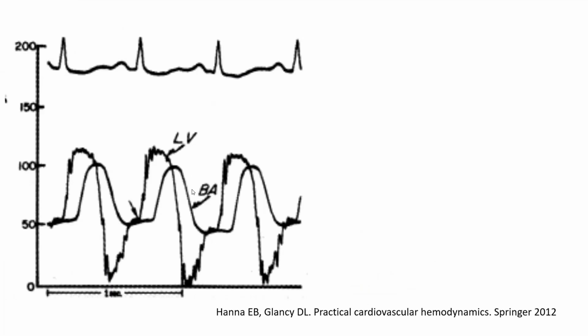The brachial arterial waveform, as in any systemic arterial waveform, compared to the aortic waveform, is more delayed and it usually peaks higher. You get a systolic peripheral amplification. This is particularly the case if you have severe AI. You get more pronounced systolic peripheral amplification of the peripheral arteries compared to the aortic pressure in AI.